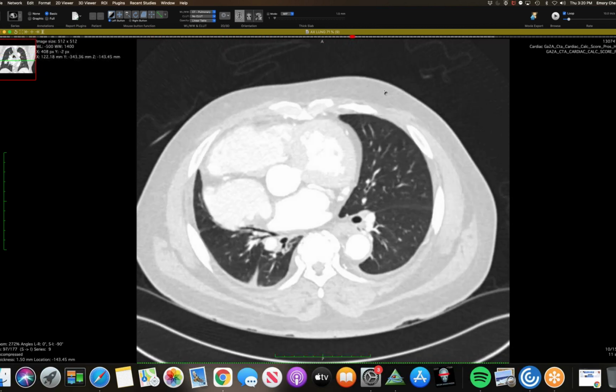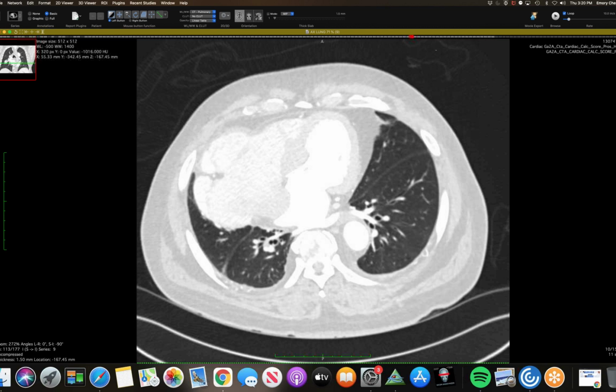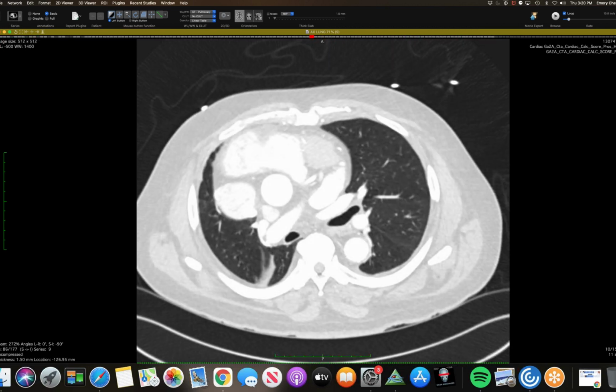And have you guys seen a defect like this on the right side? Because we never see them on the left, right? Yeah, I've never seen one like this before. That's odd.